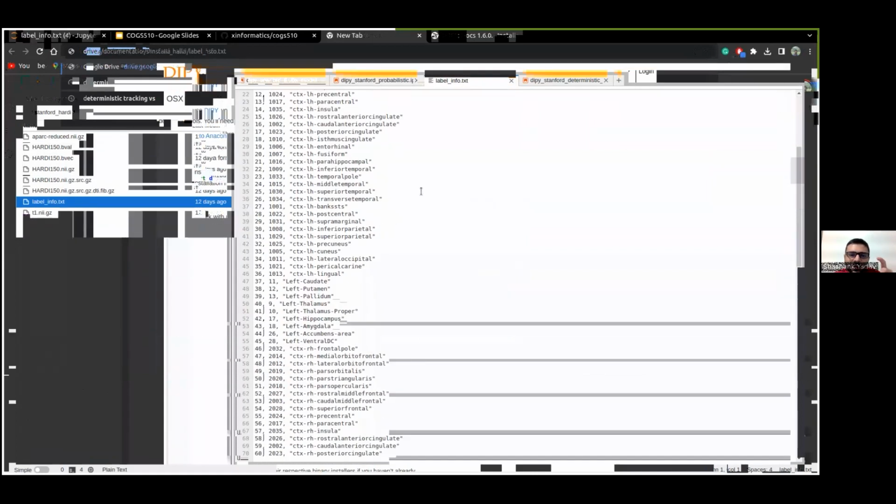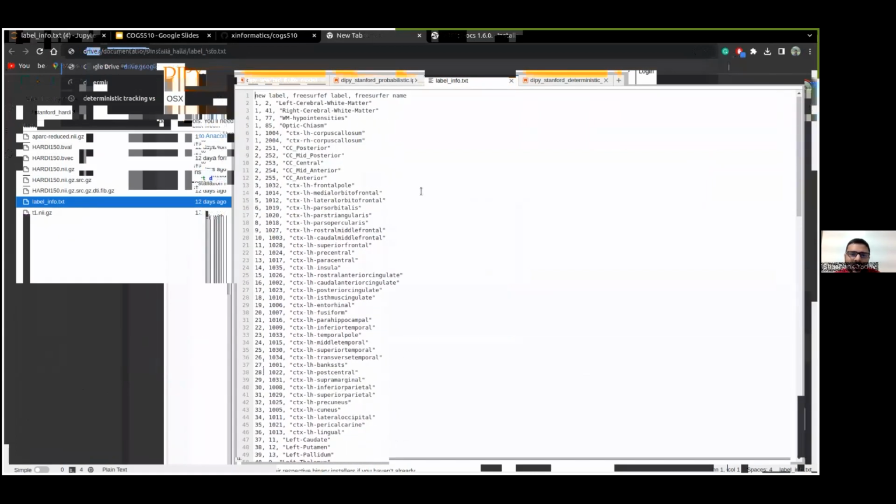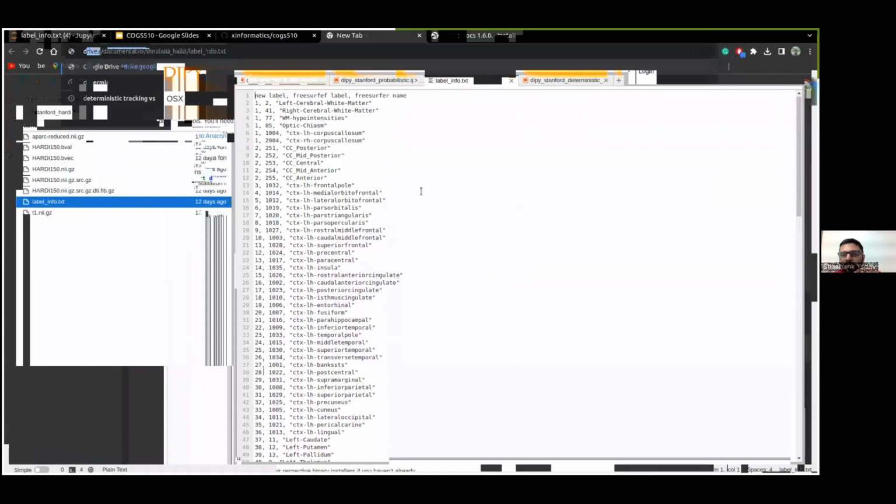So we have these here, and then you can define them. I would like to mention that with this data we get these label info images, which use one atlas and label some of the brain regions as numbers. Here, 1 and 2 are mostly the white matter tract around the corpus callosum, where all the connectivity between the left and right hemispheres happens.